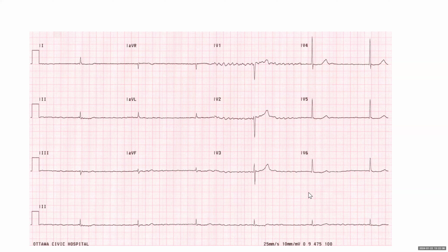Okay, let's go back. So, is it irregular? It's not irregular. And that's why there's AFib, but it's regular. So if you have AFib with regular ventricular rhythm, it must be complete heart block. This is how we make the diagnosis of complete heart block in the context of atrial fibrillation. Does that answer your question, Shari? Yeah, good. Are there any other questions?